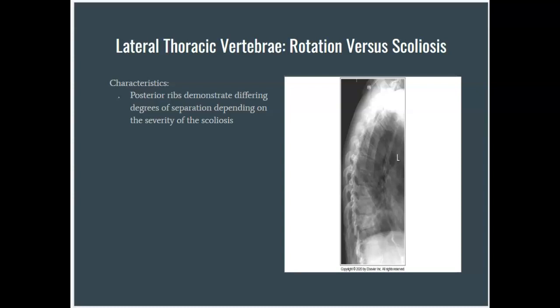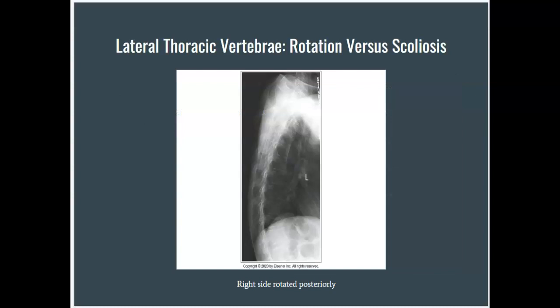So there may be sections in the spine where there is superimposition or near superimposition, but then there's separation from maybe T6 down to T12. So the best way to confirm this is to view the AP thoracic projection, because like we say, one view is no view.